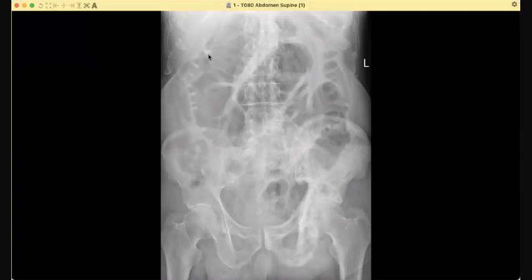However, I would like to confirm in orthogonal views or with a CT scan. I'm trying to look for the cause of the dilated bowel loops. I don't see any obvious hyperdensity, which would suggest gallstone ileus. I don't see any obvious lesion. I'm trying to trace the bilateral sacroiliac joints. However, I can't see them properly on this view.